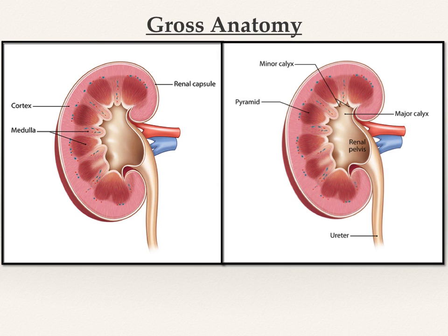If we're looking at just the basic anatomy of the kidney, this is all that we're getting at. There is the renal capsule, which we tend to not see. There's a fascia just outside of it, so that, as well as the capsule, tend to appear bright white. Then there's the cortex, kind of like the actual working part of the kidney, getting into the medulla as well. And then we get into the collecting system, or the renal pelvis there. It drains out into the ureter.